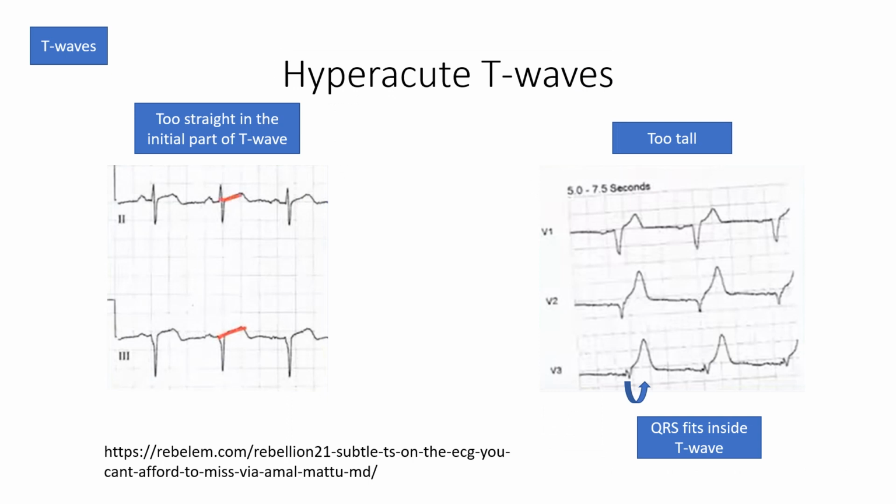We'll talk about OMIs a bit more in the syndromatic ECG, but hyperacute T waves are important to know about. Just a nuance here: the T waves can be pointy. If they're pointy, like you don't want to sit on them, then they are usually hyperkalemia, narrow and pointy.